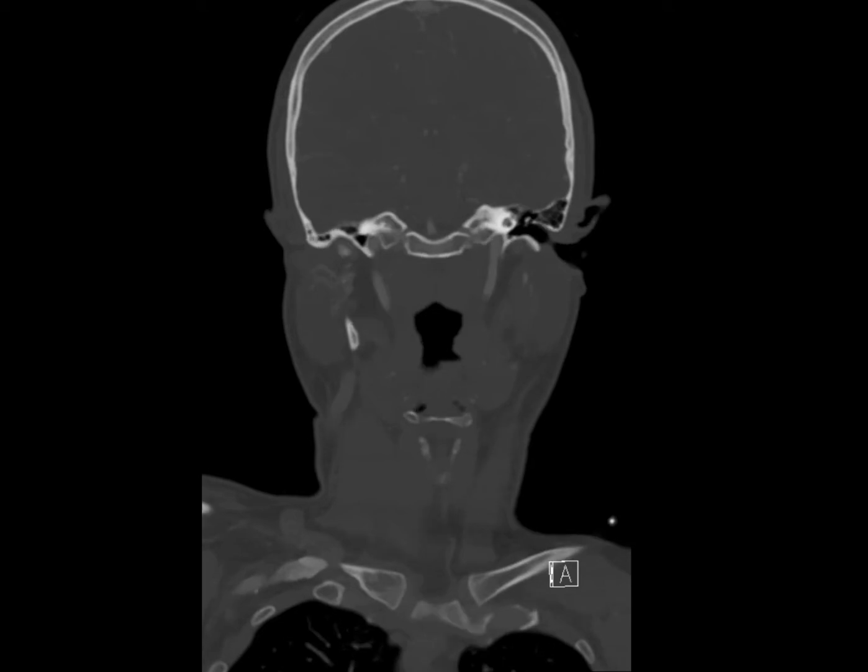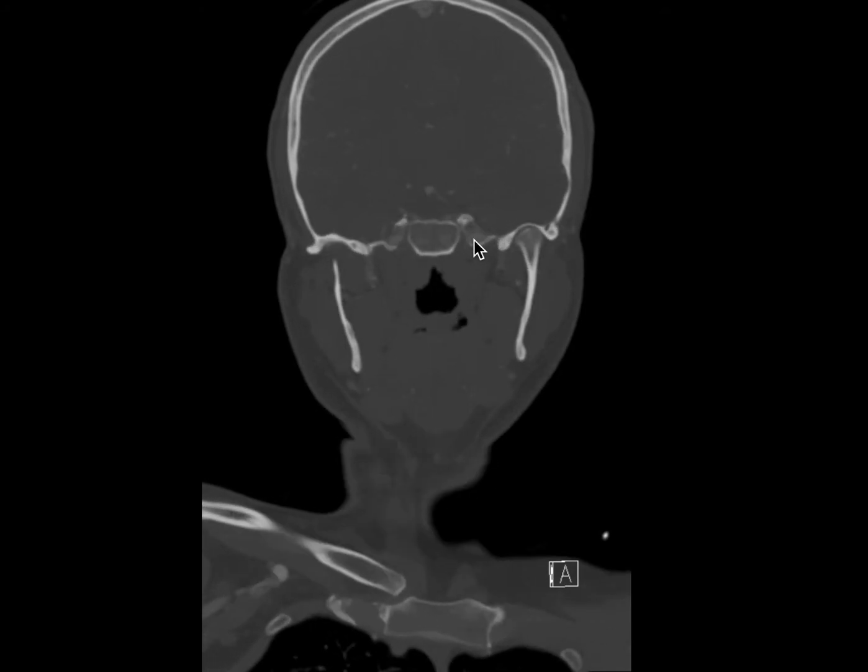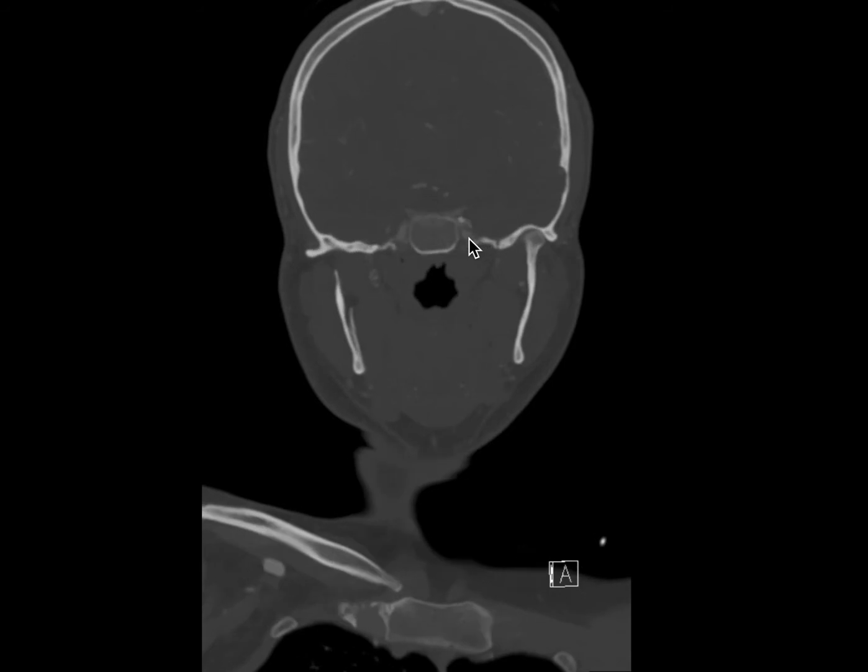I'll continue to scroll anteriorly here to watch the petrous segment go anteromedially towards the petrous apex, up to the posterior margin of the foramen lacerum. Here we have our C3 lacerum segment going over the foramen lacerum and then working its way vertically for a short segment before becoming the cavernous C4 segment, which goes up superomedially initially up against the posterior clinoid process.